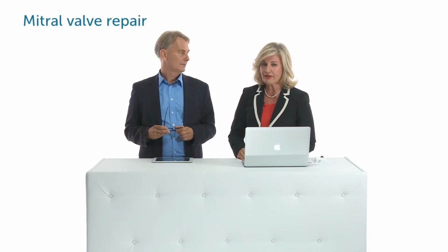So we're now through with prosthetic valves. Yes, but we have not fully covered the topic. We also need to look at mitral valve repair. We need to talk about the importance and why it is implanted. Yes, it's of course very important that the mitral valve is not always replaced but repaired, because it preserves left ventricular function and has probably less risk of endocarditis.